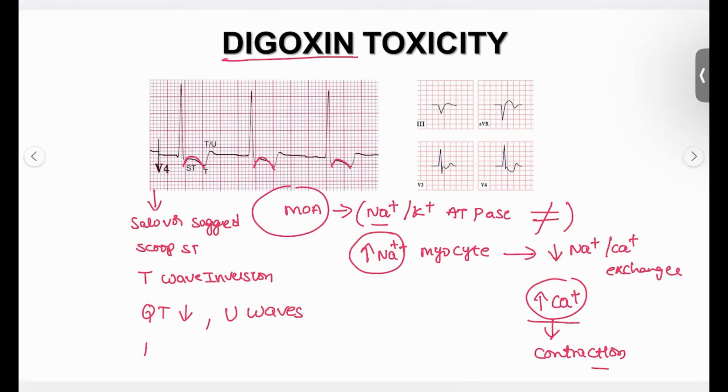How about the PR interval? The PR interval is also prolonged. So these are the specific changes that are seen in patients with digoxin toxicity.